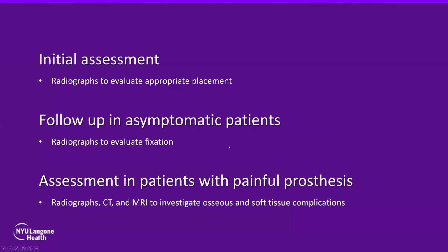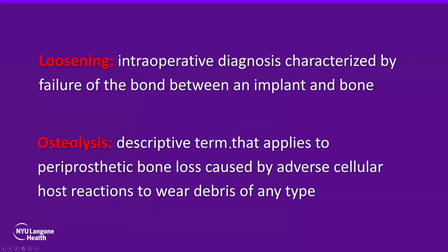Okay. So now let's get familiar with 2 concepts. One concept is loosening, the other one is osteolysis. Loosening in general is an intraoperative diagnosis. So I always tell our residents not to use the term loosening in your reports, because for loosening the surgeon has to go inside, play with the implant, and pull the implant out, and if the implant is coming out, then that's loose.